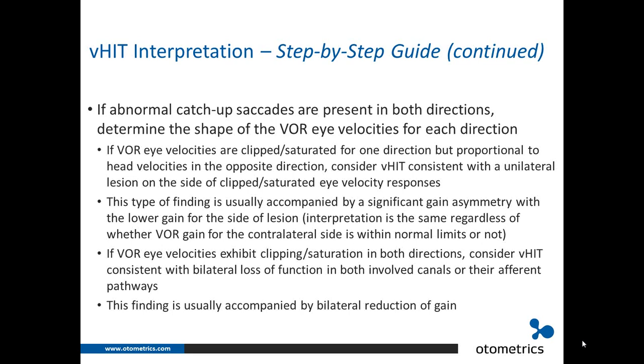If VOR eye velocities exhibit clipping or saturation in both directions, consider vHIT consistent with bilateral loss of function in both involved canals or their afferent pathways. This finding is usually accompanied by a bilateral reduction of the VOR gain.